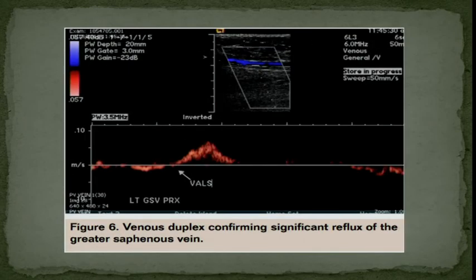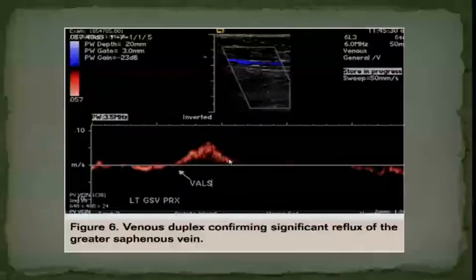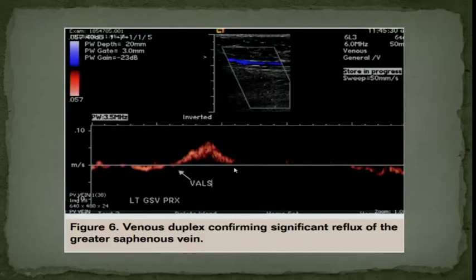All right. This is yet another image. Who should I ask this time? It's back to you, Bhavna. Is there reflux? Hunter had gone for this. Okay. Hunter, is there reflux? Yes. Okay. In this, this is 1 second. This is 2 seconds. So according to you, is this mild, moderate, or severe? Looks like it may be less than 1 second, right? So this is mild reflux, correct?